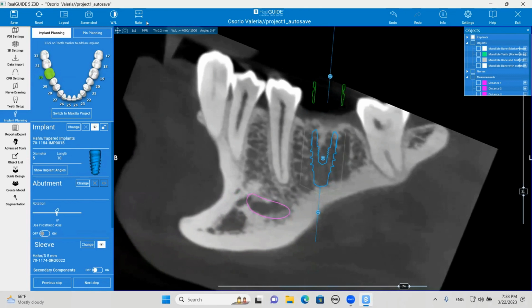Okay, so let's see, is there anything else? Hussein, did you find anything else on this case that was interesting? The anterior mandible is very, oh, okay, interesting. Hold on. Jimmy, look at that. See how, just like that other case, make sure you do some guide planes on that, and some long contact area. You're 10.9 again, which is the normal first molar. And with a 5mm implant, you'll have no problem getting a nice emergence profile on that if it's positioned right where it's at.